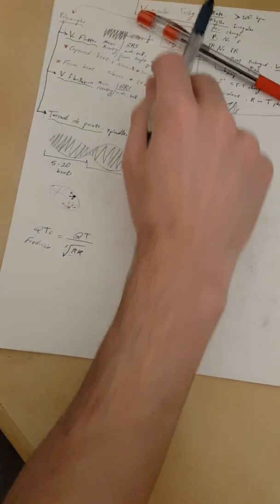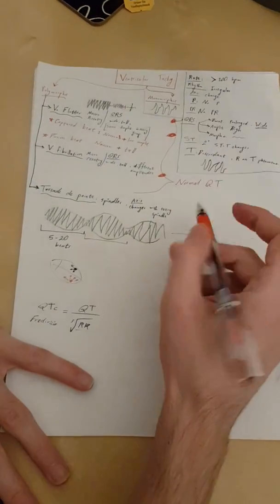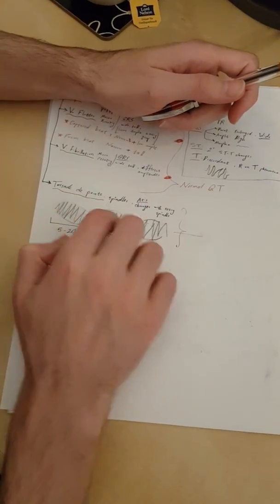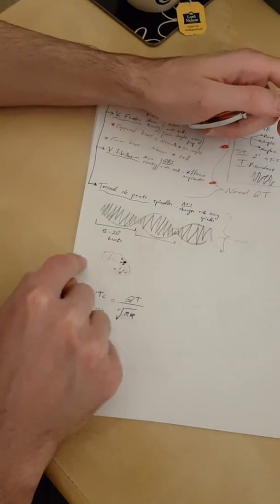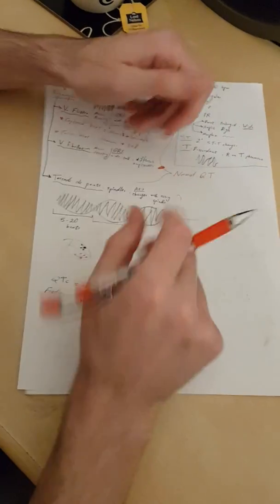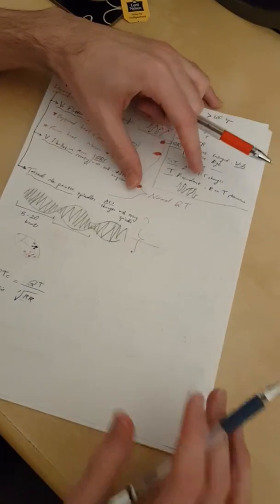In these ones, flutter and fibrillation, the QT is normal. But in this one, torsade de pointes, by the way, torsade means twisting. It's like these are a beat, and these are a beat, and these are a beat. It's like jumping. The ventricle has jumping foci, where the focus that is initiating keeps moving. I'm not sure about the pronunciation, whether it's plural with an s. I don't know. Who am I to say?